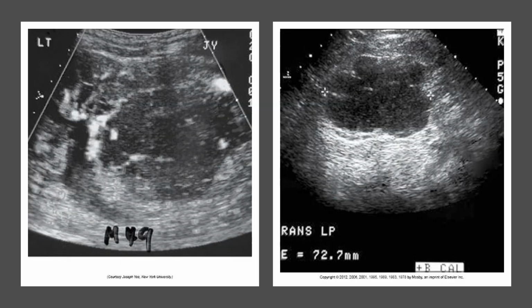And here we just have a couple examples of complex cysts. So you can see the cystic structure right here. It's definitely not anechoic. We've got a septation in there. We've got lots of internal debris. Don't know exactly what's going on with this one.